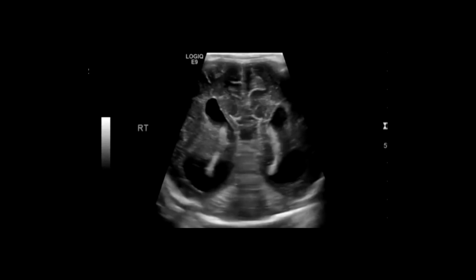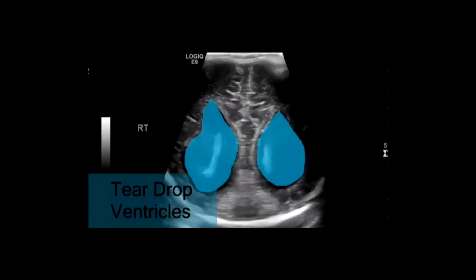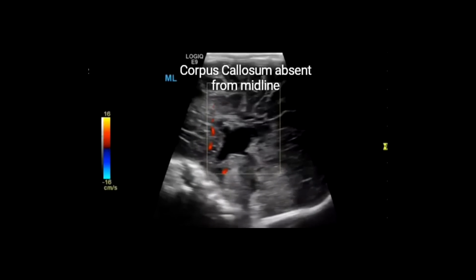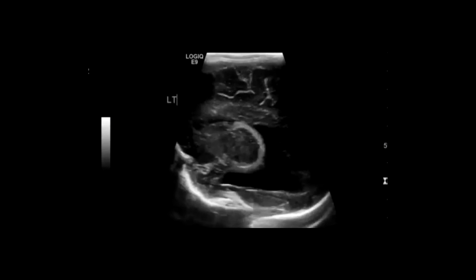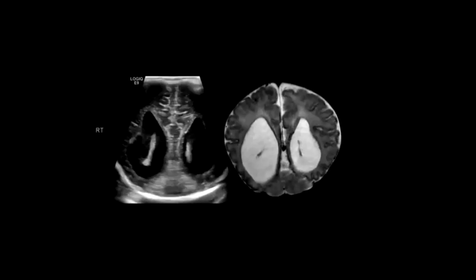And then more posteriorly, you can see the colpocephaly, or the teardrop-shaped ventricles. And here's a side-by-side view of the ultrasound and MRI. You see teardrop-shaped ventricles there.